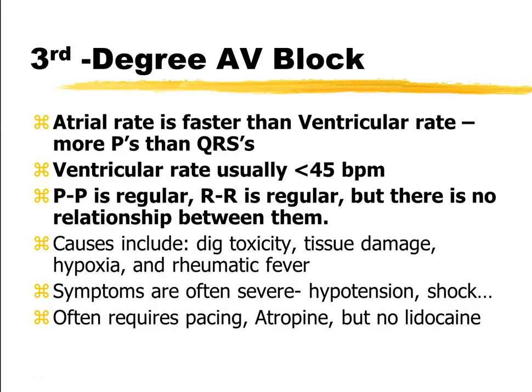So what's happening is the atria are sending an impulse, boom, boom, boom, boom, boom, and the ventricles are not getting the message, and they're doing whatever they're doing at their own intrinsic pace, which is slow. So it's like atria beat, beat, beat, beat, ventricles beat, beat, beat. It's going to be the same.